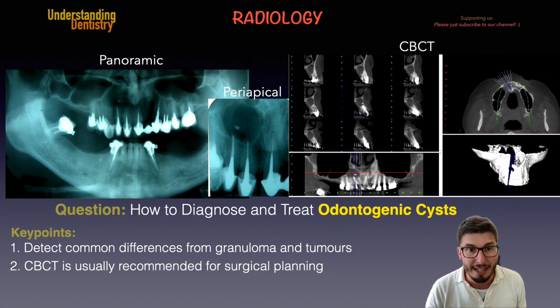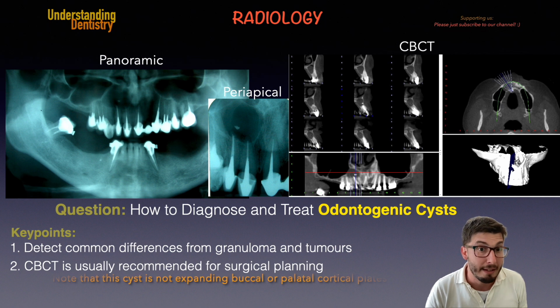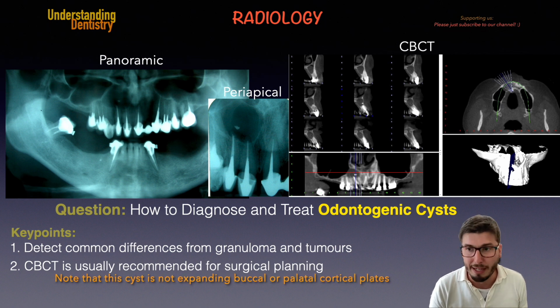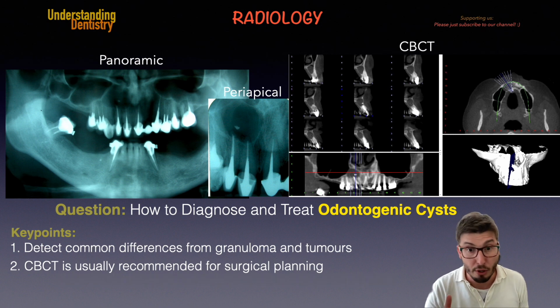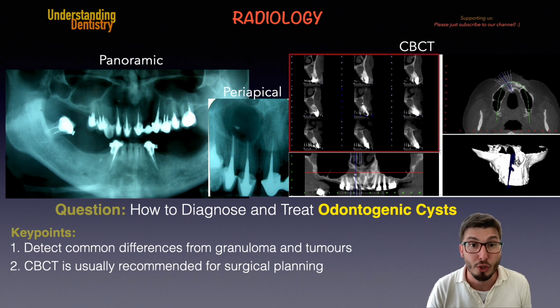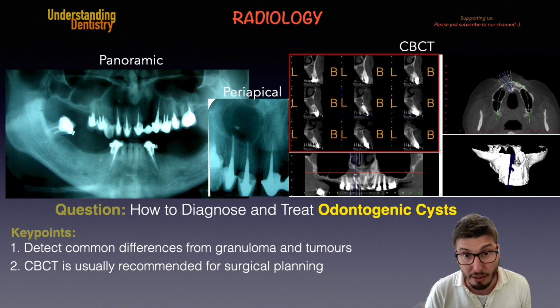So we can see that it's extending almost to the midline mesially, so to the sagittal midline, and then it's extending from buccal to palatal plates, okay? Now let's understand a little bit more about the cross-sectional images. Those inside the red square are the cross-sectional images, and the location of each of these slices is basically those blue straight lines that we can see on the axial slice.